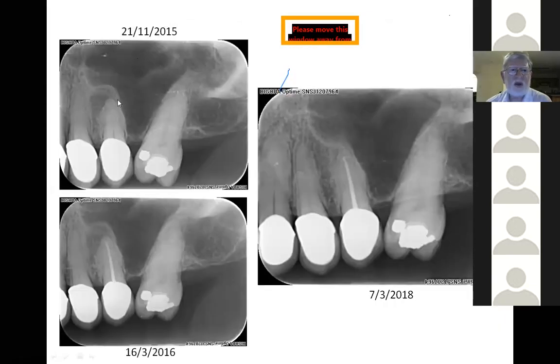Showing the 2.5 periapical pathology. And again, more for the students here, just to be able to see that after you've endoed that, when you follow up 2 years later, there is almost complete healing in that area. Note also when the sixes go, when other teeth go, how low down the sinus floor comes together, virtually in contact with the ridge.